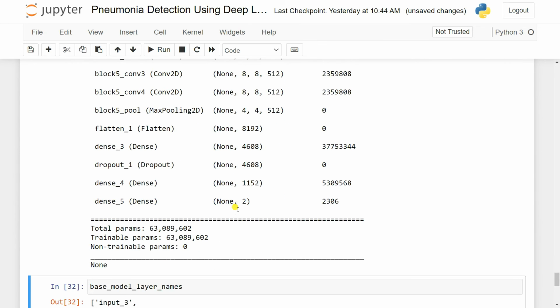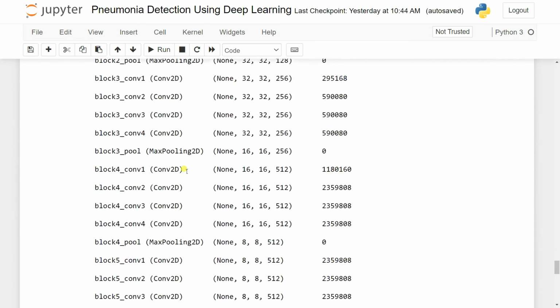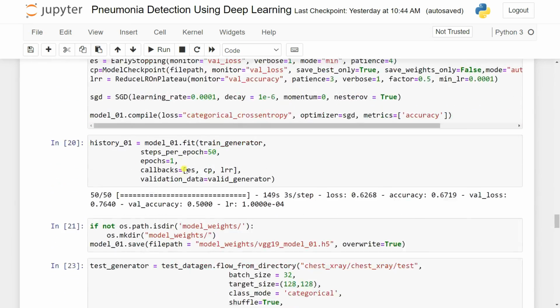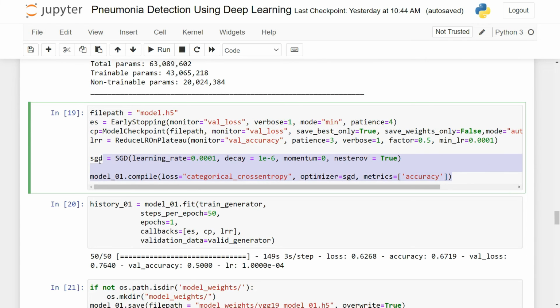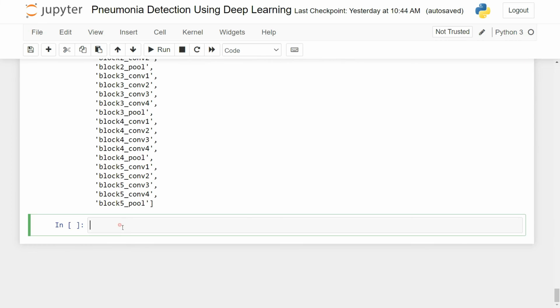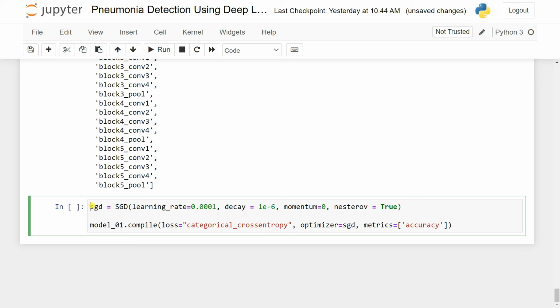Okay, fine. Now we can call the things that we saw earlier, and we can pass the same things that we did earlier. If I go up, you can see, you can copy these things. I'm simply going to copy this one and paste it here. I don't think that the model checkpoint is needed, since we already did it. We don't need it. Okay, fine.